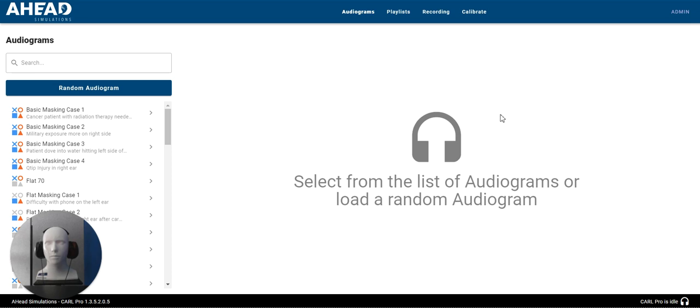I'm Rob from Ahead Simulations, but today you'll see that Carl is the one on camera. This is because we're going to run through a hearing test of Carl where I both walk through the interface and you can see as Carl responds during a hearing test.